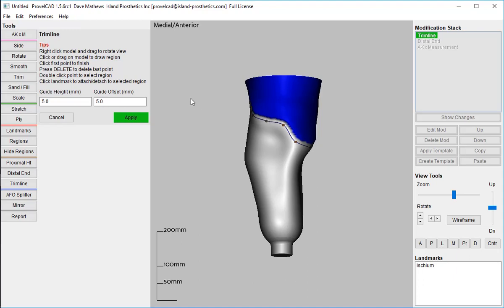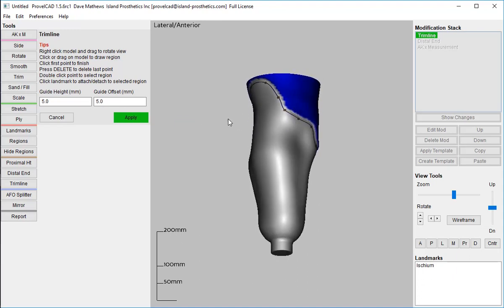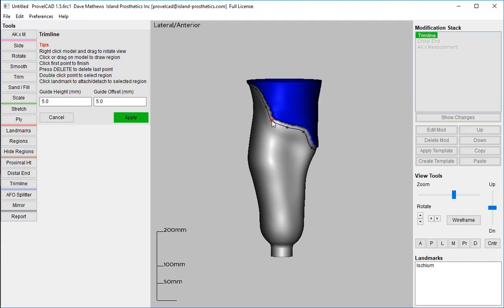Okay, look this over, add it accordingly. That just defined our point.